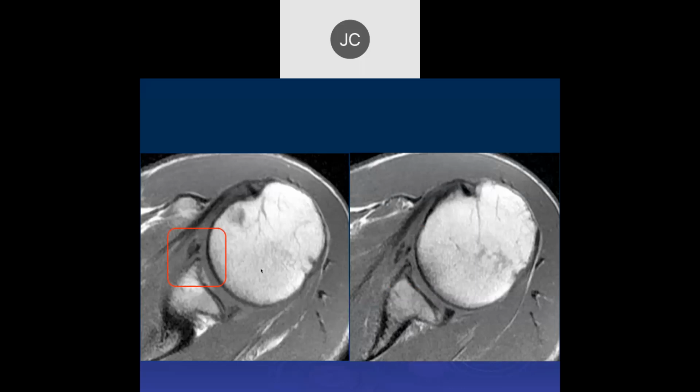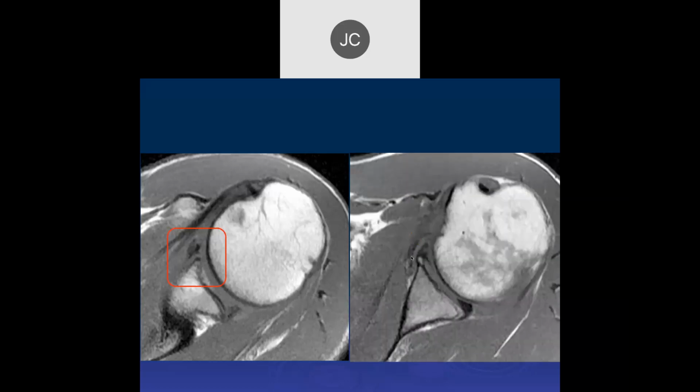Okay, and what do you see coming farther down? See a separation here. Maybe we're getting down to where there's a labrum. So what are those two things? Could it be the middle glenohumeral ligament that's possibly torn? So, maybe the labrum there. Okay. If we go farther down, what does it look like now?